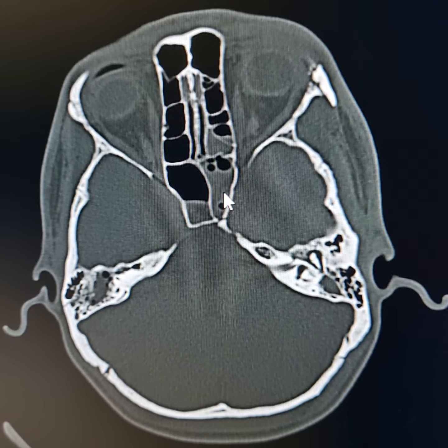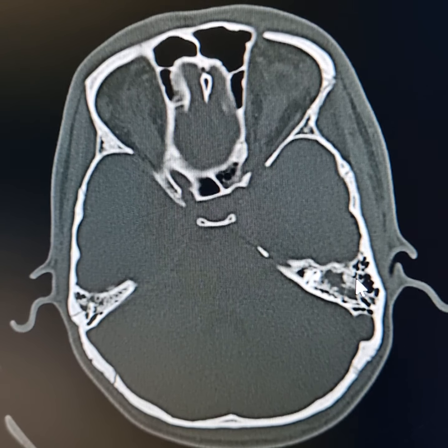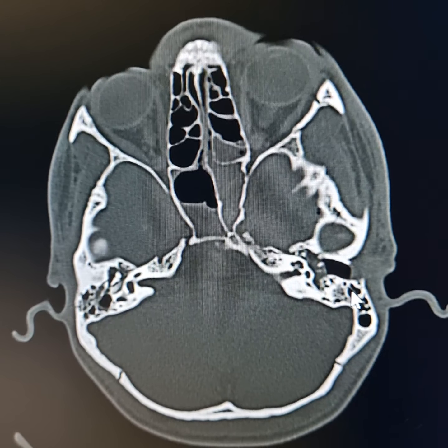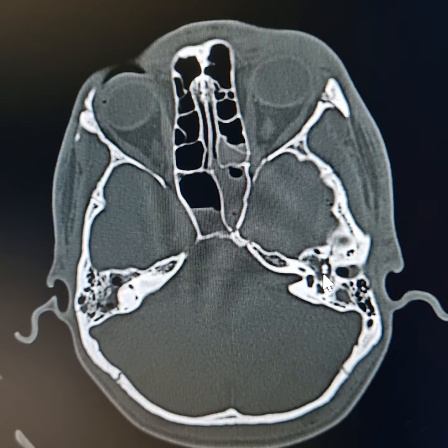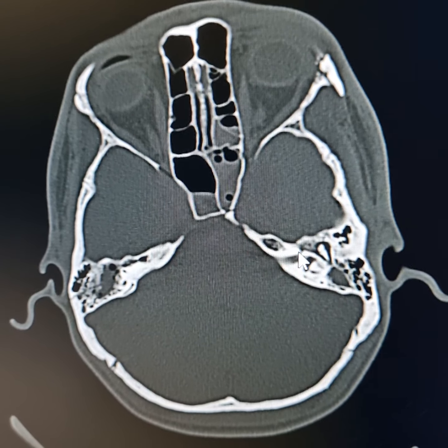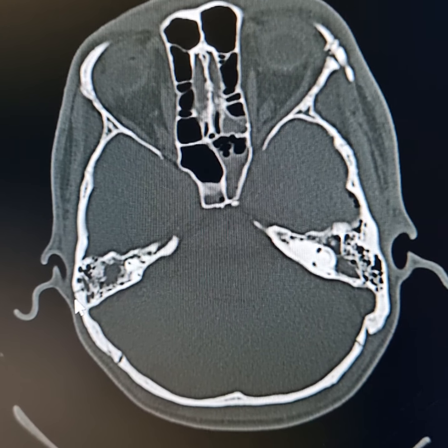Now these are the hemorrhages in the sphenoidal sinus. Now these are the hemorrhages in the left mastoid air cells and the left middle ear cavity. Now, the second lesson to be learned is that please do not be satisfied by the findings on the left side. Now please come on to the right side.